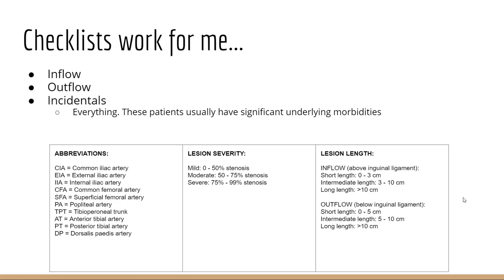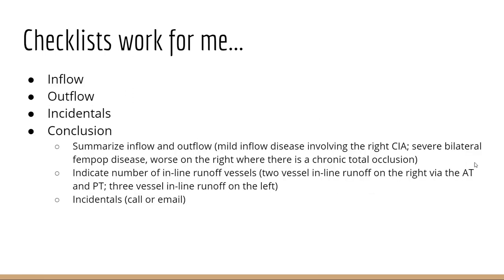So in my reports, I don't actually do proper measurements. I don't mention, oh yeah, the right common femoral artery demonstrates a 72% stenosis. I'll just call it moderate. A moderate, shorter focal length stenosis.